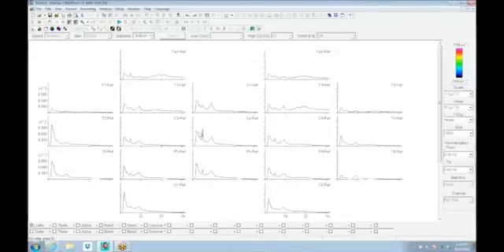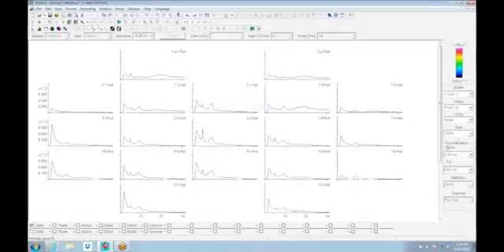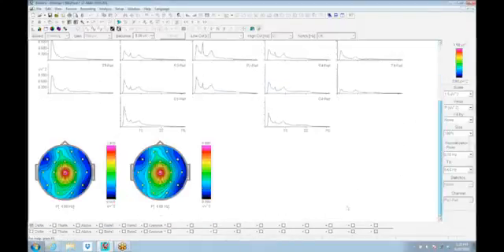Thank you. Down at the bottom, go ahead and do a crosshair. You'll get your microvolts and also the hertz at which that crosshair is at. You can see in your y-axis and x-axis that would match up with that. Then if you right mouse click at that point and click Add Map, it creates a map down below of the feature that you had just isolated.